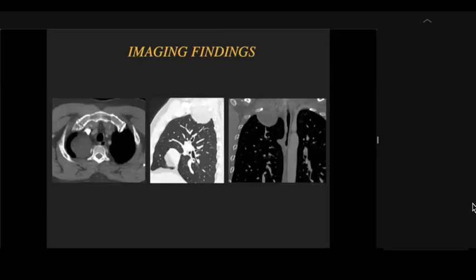These are the imaging findings. The CT of the chest revealed a right apical intrathoracic and well-defined mass extrinsic to the pulmonary parenchyma. You can see that the lesion extends superiorly above the first rib without any bony destructive changes. The density of the mass was of fluid attenuation.